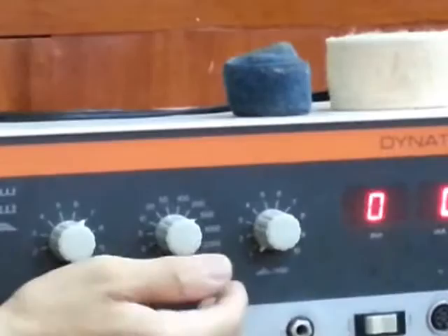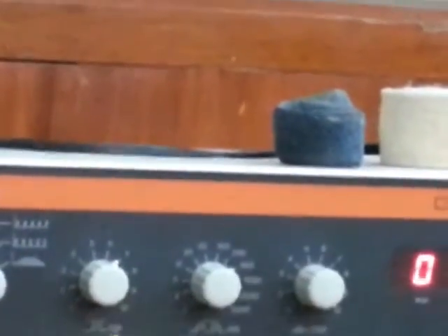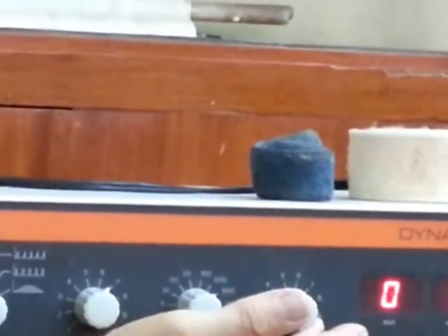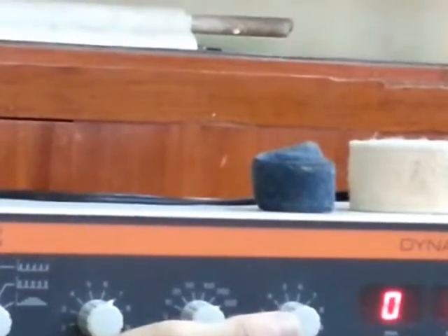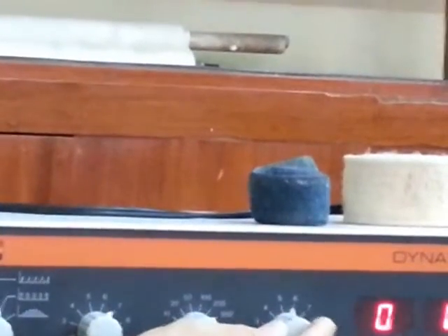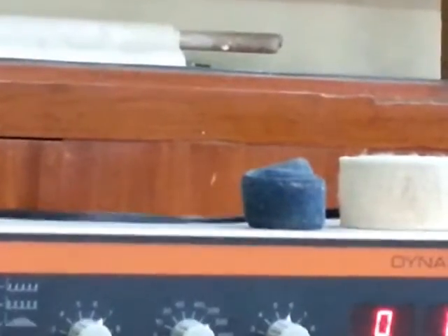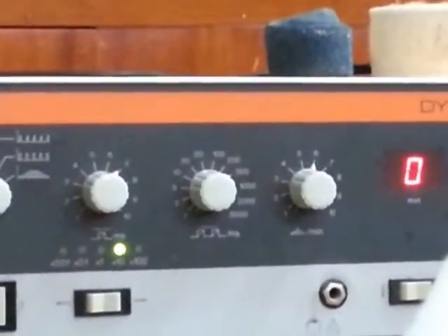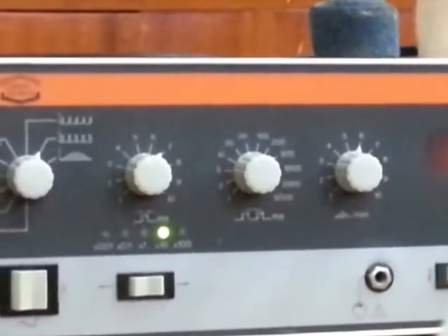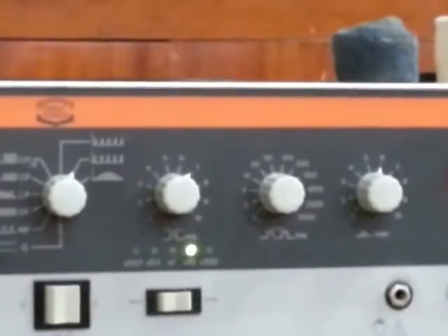Yeah. And next, this would be your surges per minute. You have from 1 to 10. If you choose 10 here, that will indicate you have 10 surges per minute. If 6, that would be 6 surges per minute. When you say surges, it means an increase or decrease. So 6 means you contract, relax, contract, relax, for 6 times. Okay, 6 surges per minute.